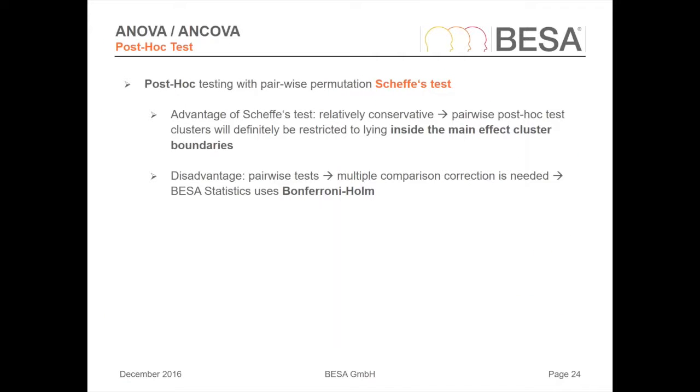For the post hoc test, we decided on the Scheffé test because it's relatively conservative. So the pairwise post hoc test clusters will definitely be restricted to being inside the boundaries of the main effect cluster.